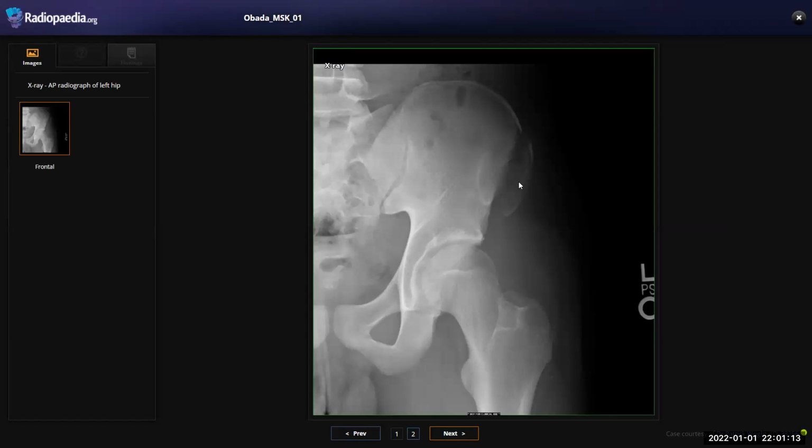This is very good. Anterior superior iliac spine avulsion fracture with associated extension into the iliac crest. So it's not just limited to the anterior superior iliac spine, which is the sartorius muscle. Also, the abdominal muscles attach to the iliac crest. This extension is common in track athletes. The whole avulsions are rare, but when you see both of them fractured, it's more common with track athletes, especially when they just start running.